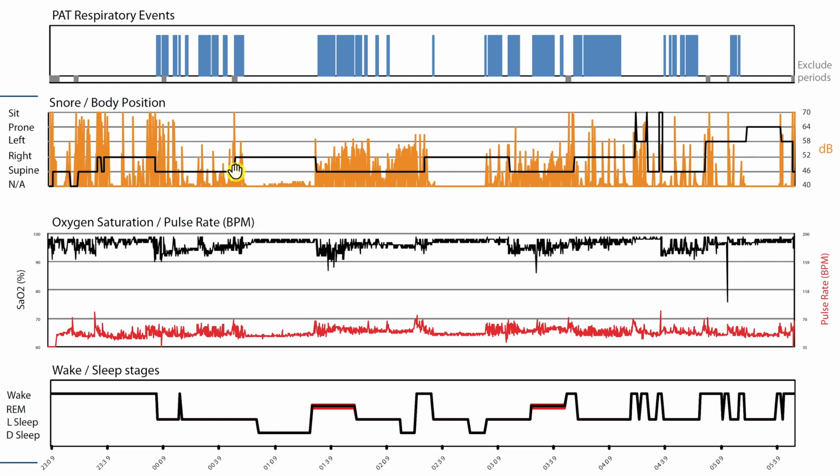And then what happens? I go up to my right side and there's no snoring and my oxygen levels are stabilized. Okay, well, maybe I should sleep on, and also my heart rate, and I'm even in deep sleep. Oh, okay, maybe I should try sleeping on my right more. It seems to statistically be the better option. And we do see this a lot. It's called positional apnea. Almost everyone is going to have worse apnea on their back. That's just standard. It just makes sense, right? Because your tongue and all your soft tissues and stuff are kind of crowding and dropping back into your airway.